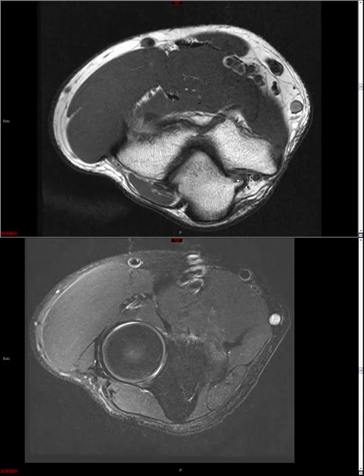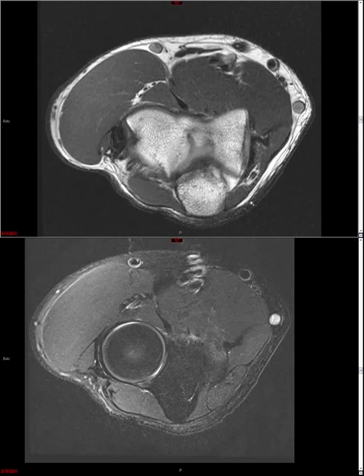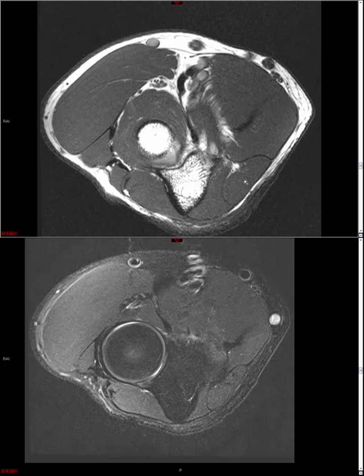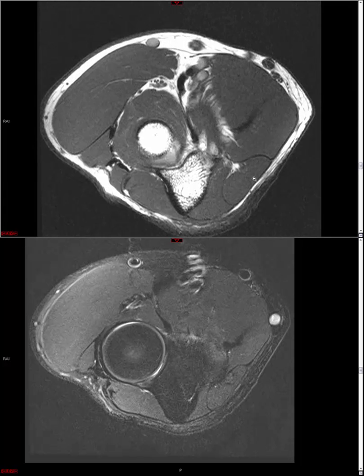And you see here there's a strategically positioned osteophyte coming off the olecranon. It's a sort of osteophyte where anywhere else you'd say no biggie, you might not even report it, but I think in this strategic location, well worth reporting because it may be impinging upon the ulnar nerve. Alright. As we go more distally, you're going to see a single muscle that encircles the ulnar nerve. That's the flexor carpi ulnaris. And then more posteriorly is the flexor digitorum profundus, and both these muscles are innervated by the ulnar nerve. So that's a helpful memory aid.